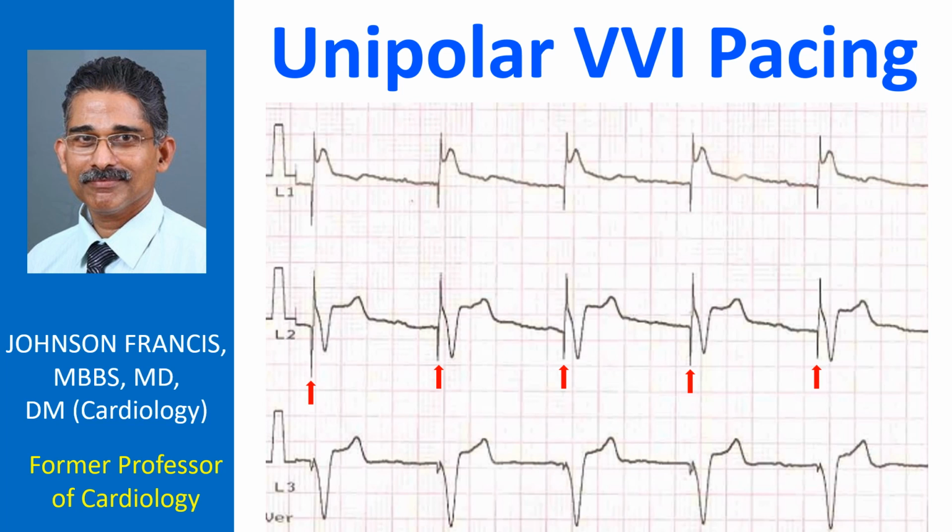In that situation, as the current circuit is completed within the ventricle itself, the spillover to the surface ECG recording electrode is small, so that pacing spikes are quite small and hardly visible in some leads. Transvenous temporary pacing is always bipolar, as the pacemaker is not implanted within the body and hence cannot act as an anode. Permanent pacing can be programmed in unipolar or bipolar modes.